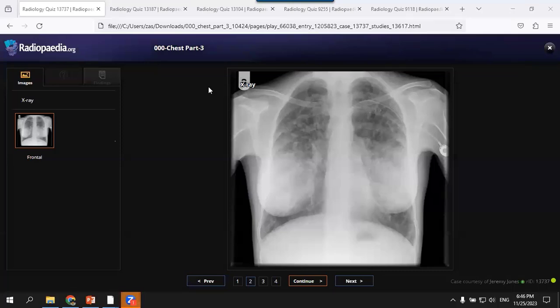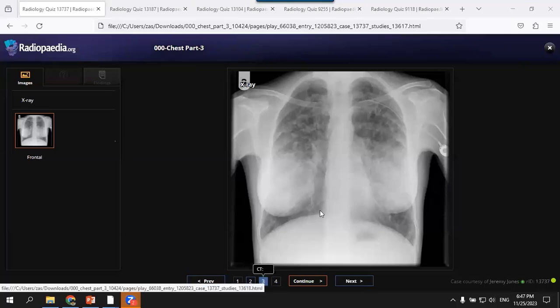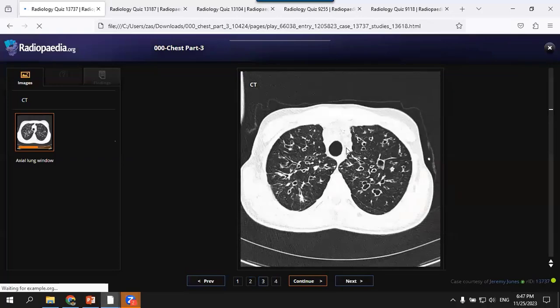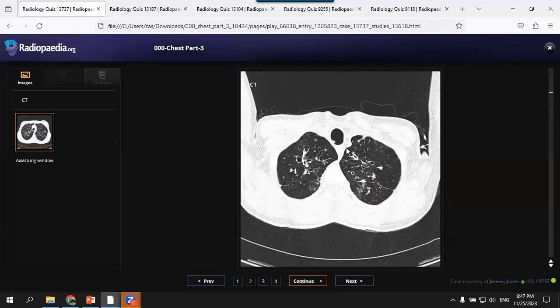By the way, in the exam, don't expect all examiners will be kind. Many of them say, are you sure? Are you sure? Are you sure? This is an example. Another example will be so aggressive. So don't expect all to be kind. You have to be self-confident. Okay, it's cystic fibrosis.